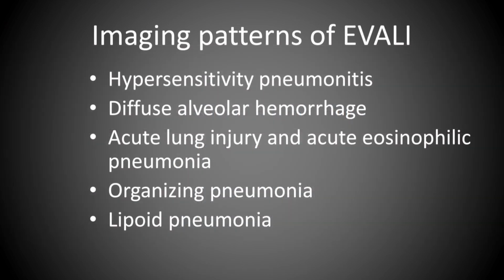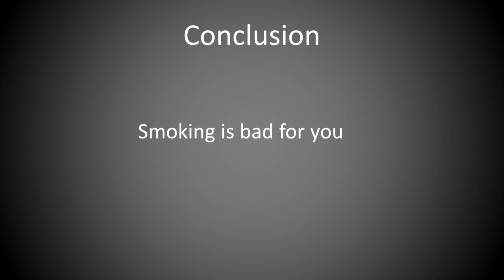And they report that there are many imaging patterns. Again, the ones I've seen sort of look like organizing pneumonia. I think lipoid pneumonia is within that, acute lung injury, diffuse alveolar hemorrhage, and even a hypersensitivity pneumonitis has been reported prior to this sort of THC phase. So here's my conclusion. Smoking's bad for you.